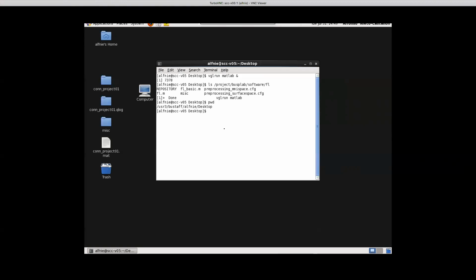So this idea of going to the FS average, like the spherical space, that's true. When you load it up, you have these registration files, and you can look at it in the subject space, just basically a one-to-one mapping, right? I think, is that correct, Alfonso? Yes, exactly. There's a one-to-one mapping between the two of them.